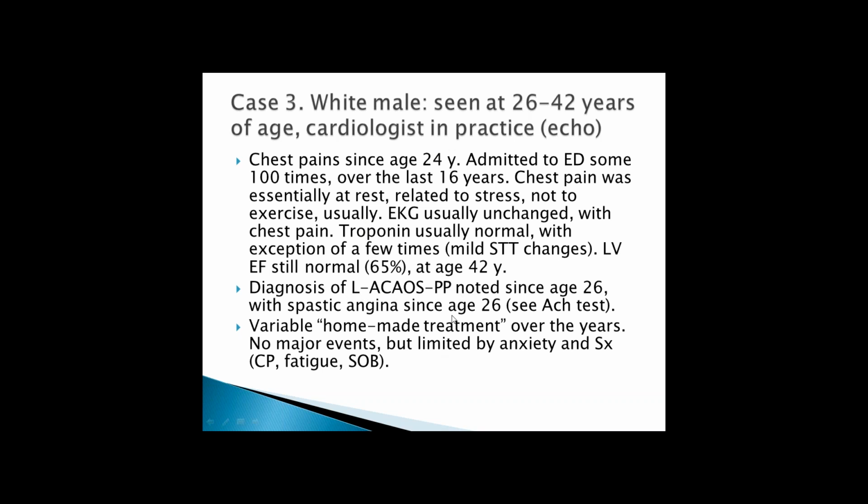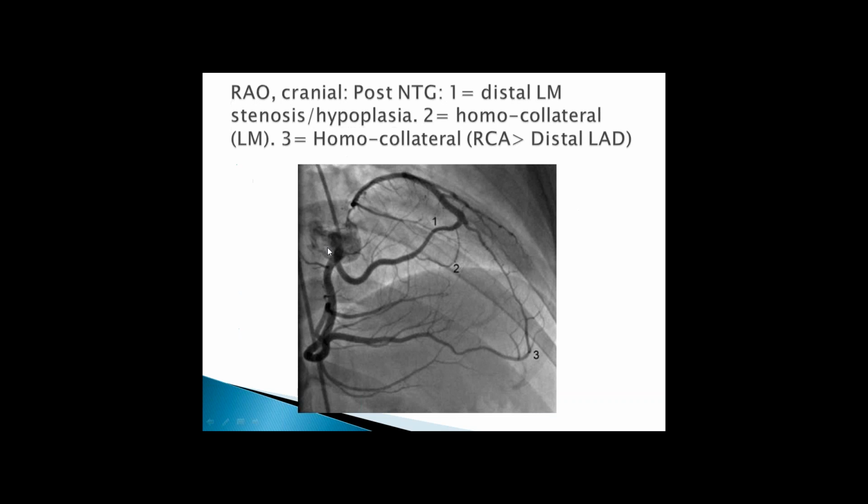At that time, medicines like before, nitrates, calcium antagonists, and arginine were given and had a discrete improvement symptomatically, but he continued with some spells, and as we mentioned here, he was in the emergency room some 100 times over the last 16 years since presentation. This is the initial movie.